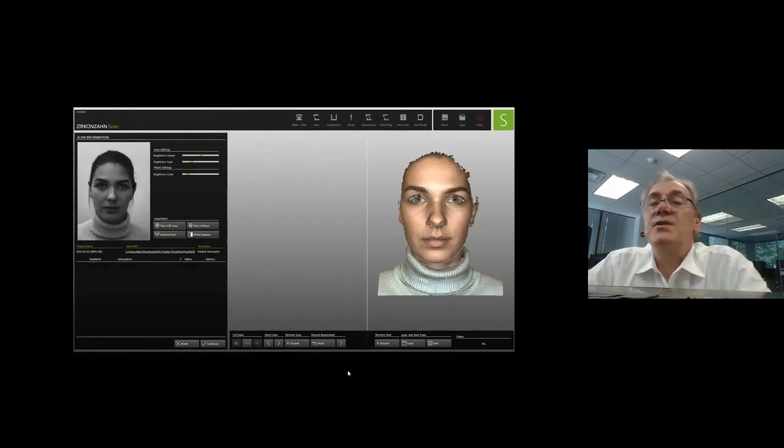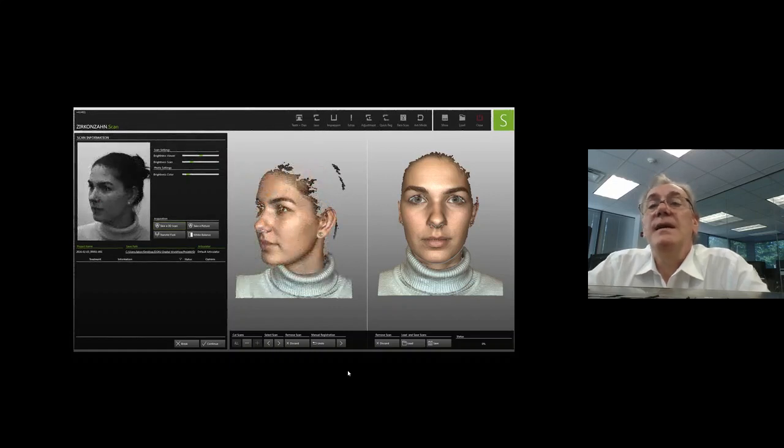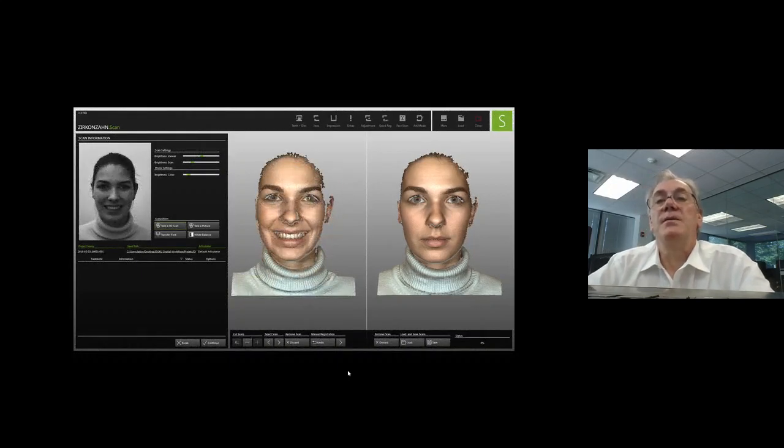And then we can proceed by taking all the aesthetic photographs necessary for the aesthetic evaluation of the patient itself. So the first most important is creating a 3D image of the patient. Therefore, a straight photo, a 45-degree left, where we have the opportunity to visualize the actual tragus of the patient, and a 45-degree right with the same necessities. These three images are merged together, and they'll create a single front face, mouth closed image that we will use for the mount in the articulator.